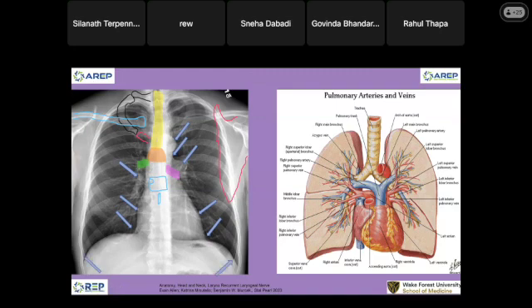And then we'll take a little peek at the bone. Now we're gonna look for this anatomy. I'm gonna ask you, what is this structure? Okay, I'm gonna point it out here. What do you call this structure right here? I'll show you on the CT. We call it the sulcus, but the name will change.